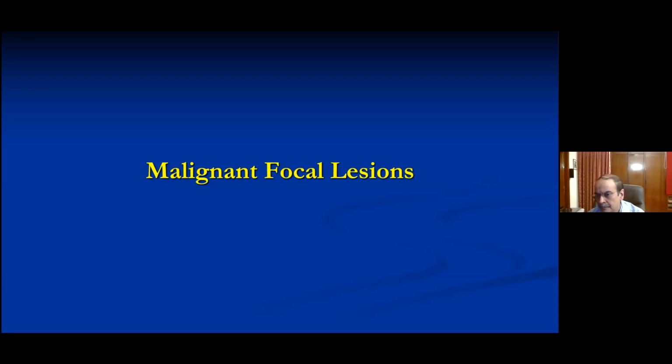This is Dr. Subhamoy Das from Kolkata, and he's asking about differentiating benign cystic lesions and the possibility of HCC on T1 imaging. So only on T1 you would not be able to do it. You would definitely need to inject contrast. As I said, a simple cystic lesion will show no contrast enhancement, whereas an HCC will show definite arterial phase enhancement. You definitely need contrast.